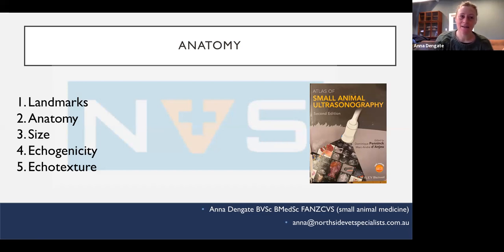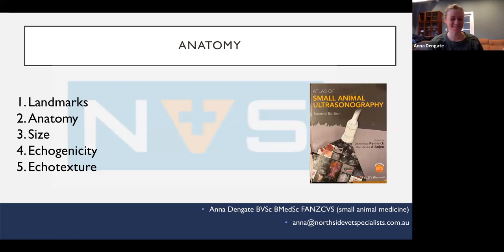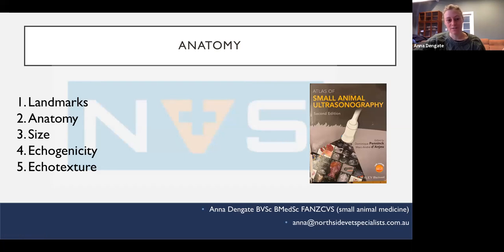And there's another thing that you can compare it to, and in surgery, sometimes when they're desexing female dogs, they take it out, which makes it a little bit harder. What am I talking about? The ovary. Falciform ligament. Good. It's not the uterus.